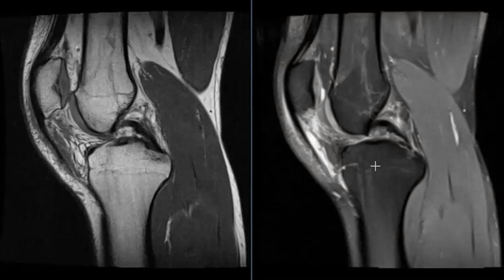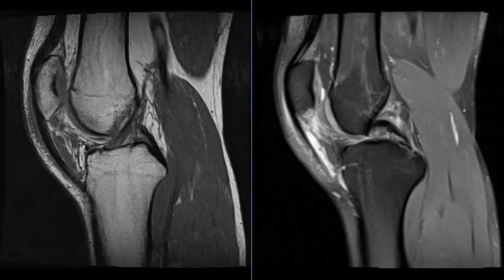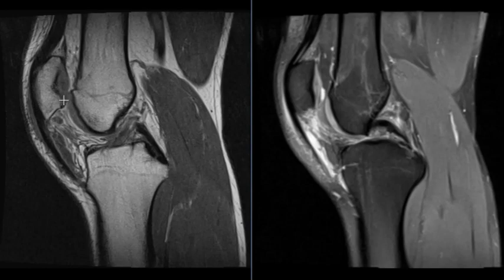Hello, this is Dr. Gay from First Sick MRI, and this is a 29-year-old male with complaints of knee swelling anteriorly for many years, about 7 years. He had a diagnosis of prepatellar bursitis, and he's had an acute flare-up here and wanted to get another view of this. And on this view, we see the kneecap towards the left here.